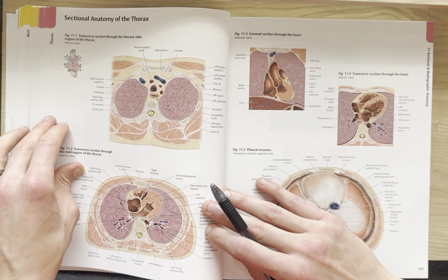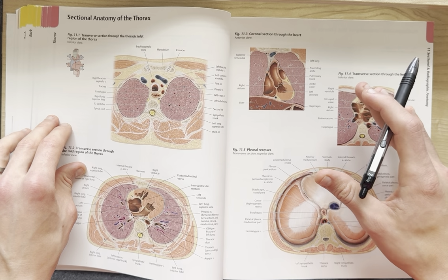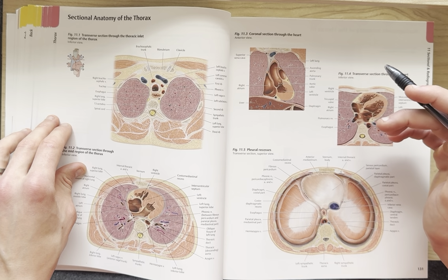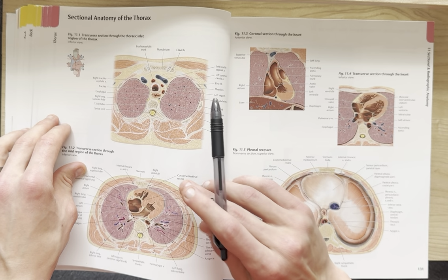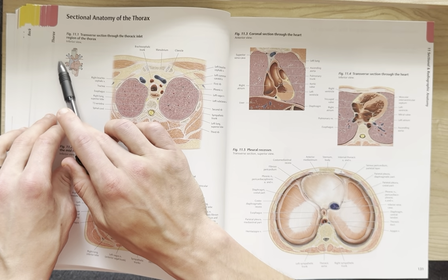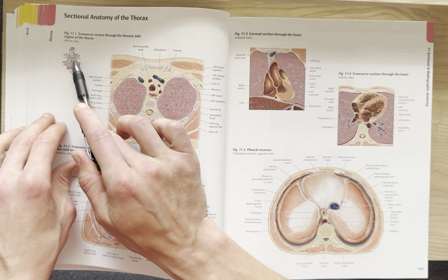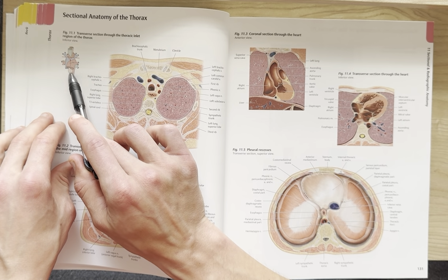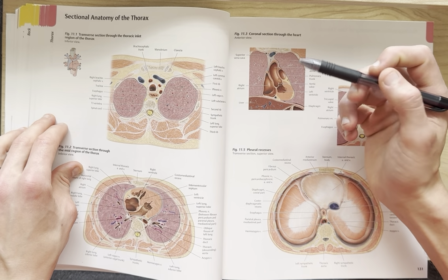So we've got sectional anatomy of the thorax. We've got a few cross sections and specific looks that they're going to give us here, and then we're actually going to get into the images that they're providing. In this image here, we've got an inferior view, so we're at the bottom looking up into this cross section, and it's pretty much cut through the trachea, the esophagus, and the major blood vessels here at the top. So it's just above the level of what looks like the ascending aorta. It's just above that. So let's take a look here real quick.